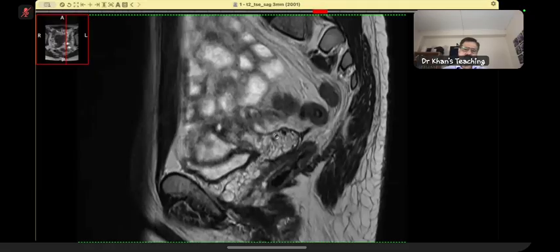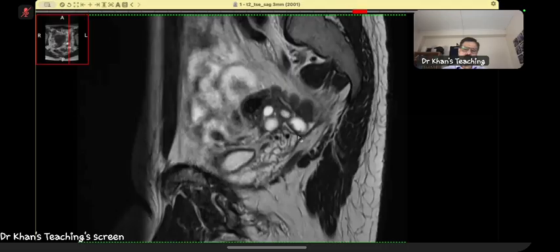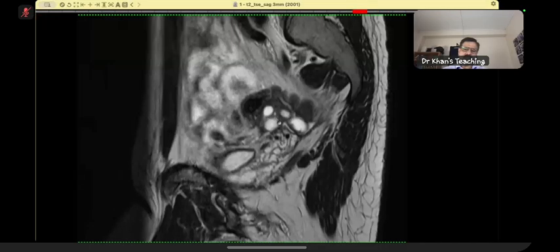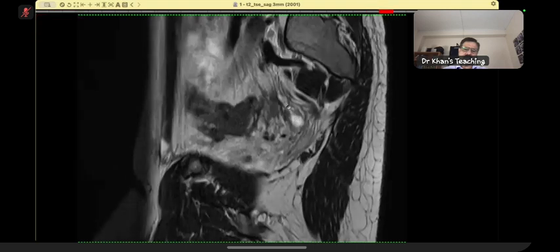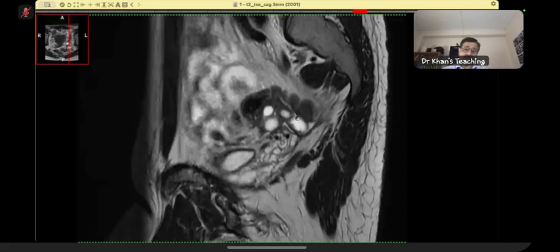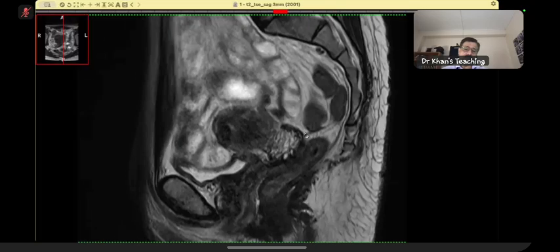It is all thickened. It goes to the ovary, close to that. It goes close to this cystic lesion. Now these are ovarian cysts, and this one, if you see, is convoluted, what we call the appearance or configuration of this. So it looks like a tube. And this was a key finding to be picked up.